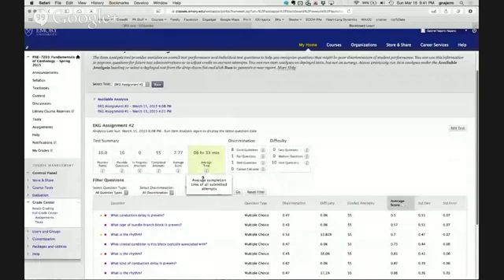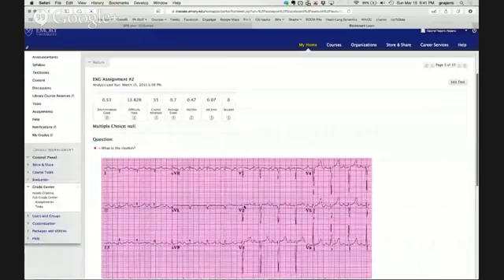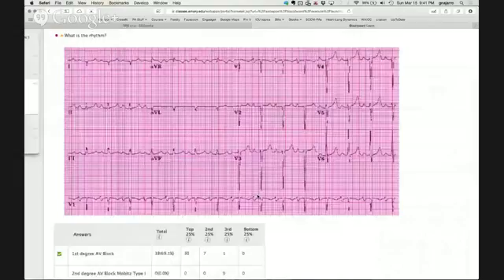Okay. All right, so that's that question. Let me go back to sharing my screen. All right. The next question is here. What's the rhythm?